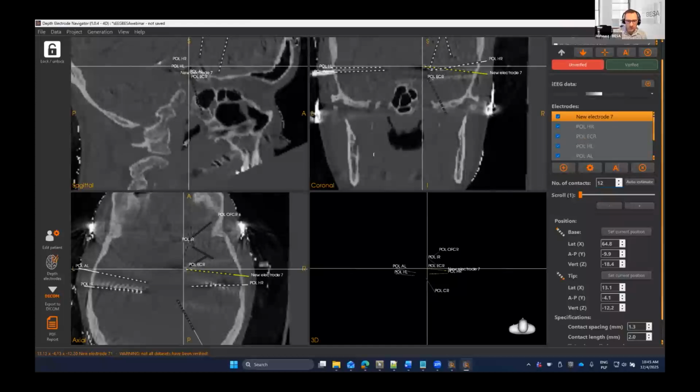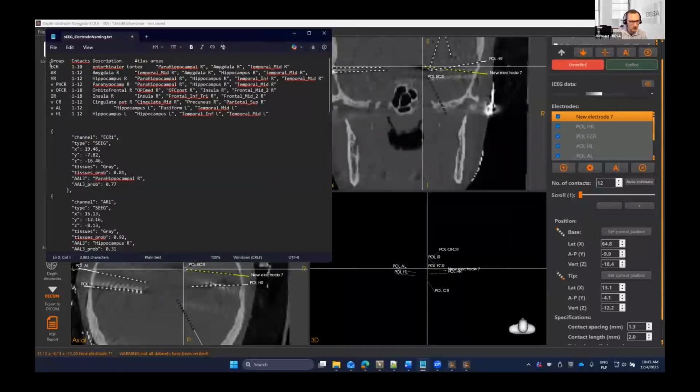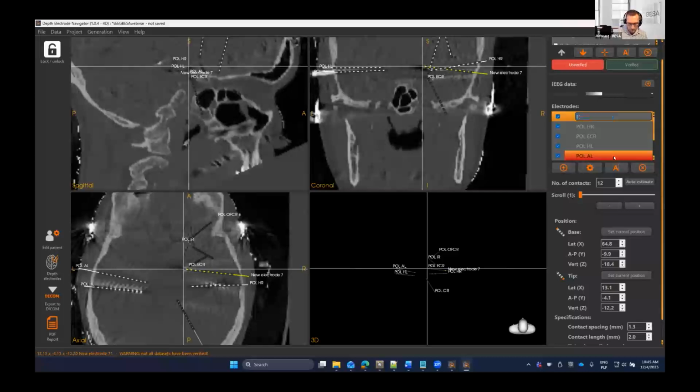And that was ER, we set ECR, we set HR, and now we have this PHCR, if I'm not mistaken. Yes, so that will be it. And the last one.